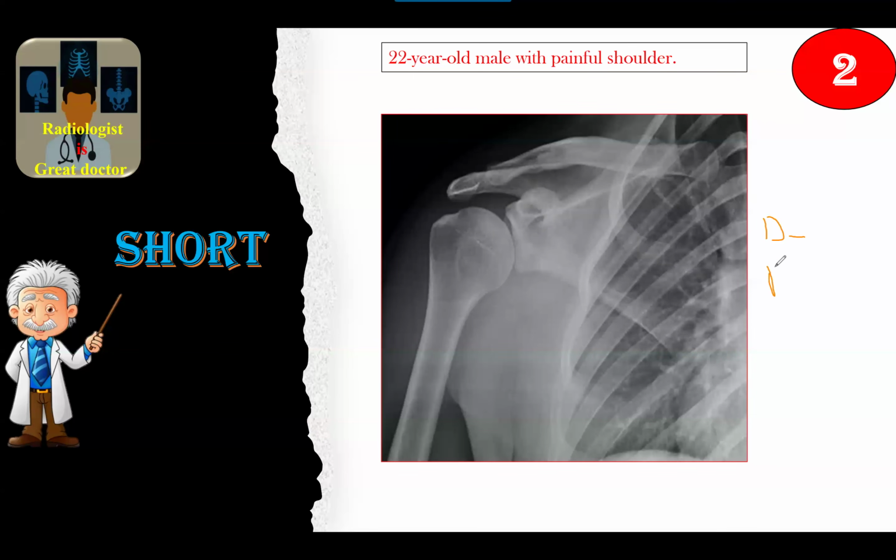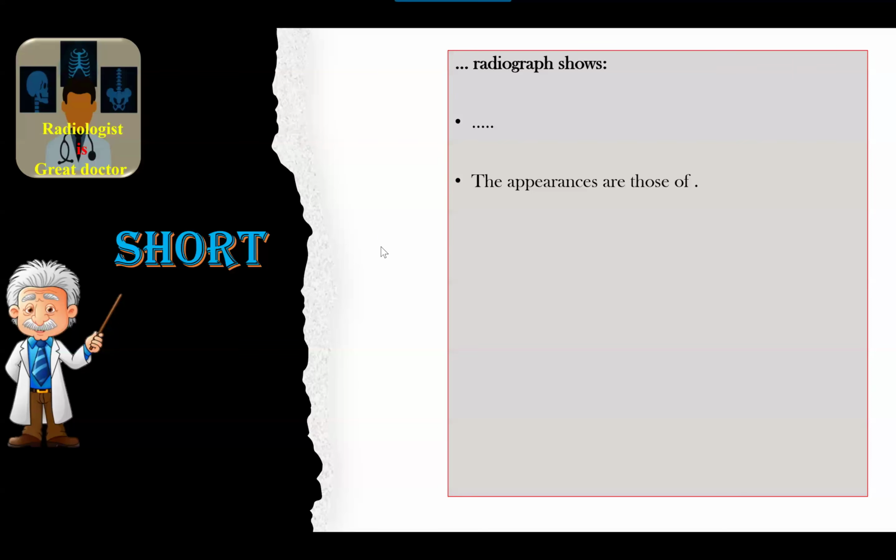Discuss the findings, review other views, and MRI of the shoulder. And also review history of recurrent shoulder dislocation or previous shoulder dislocation. You need to mention history in your management. These two items regarding the trauma.